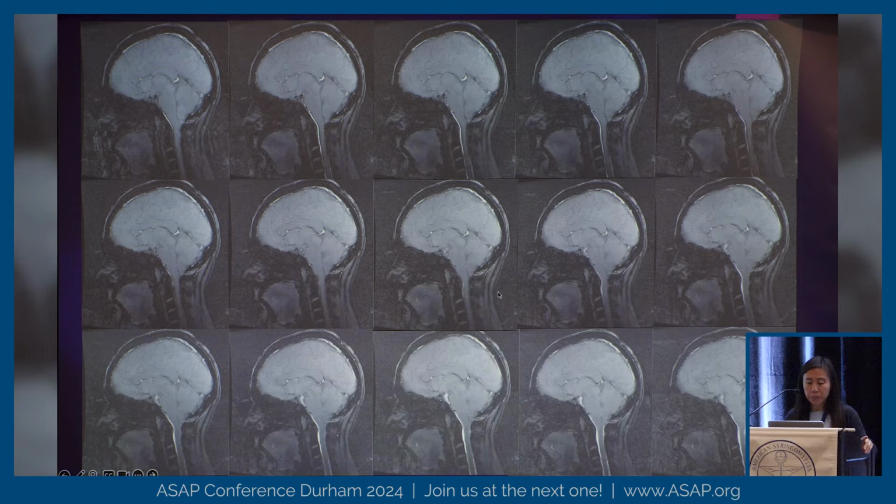In the back of the brainstem and the cervical canal, where the cerebellar tonsils are at the foramen magnum, I don't see that white line really at all, maybe a hint of it here. So that means the flow in the back is not as robust as what's in the front, which is what is concerning in a lot of Chiari patients.